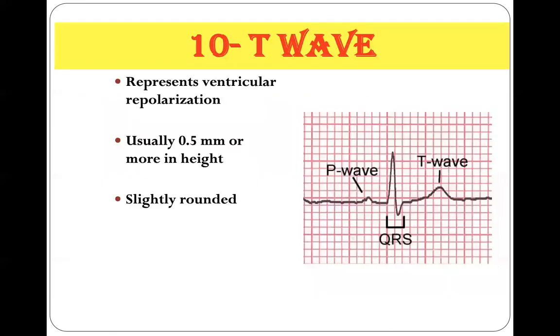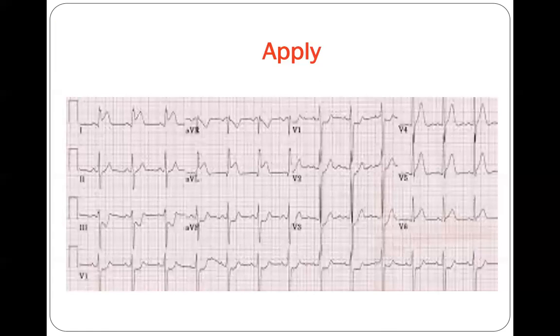I know that the ST segment is one of the challenging situations in ECG. At first, we have known that the ST segment is an isoelectric one, but sometimes there are pathologies that produce ST segment elevation, and some pathologies that produce ST segment depression, and ST segment depression may be a horizontal depression of ischemia, maybe down-sloping depression, or maybe upsloping depression, and finally maybe sagging depression of lanoxin toxicity.